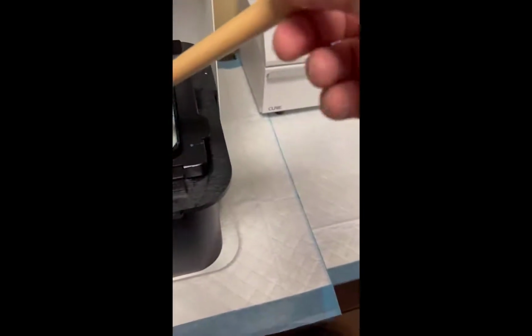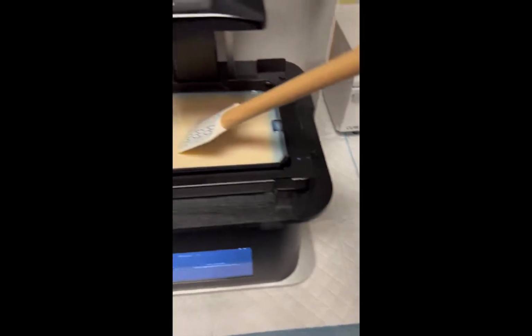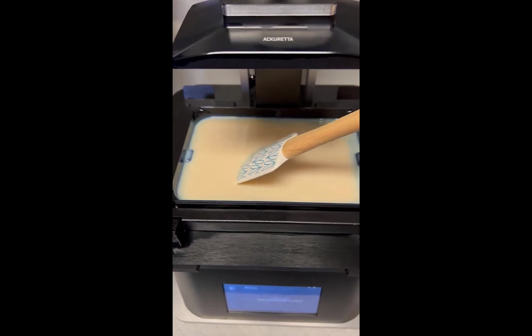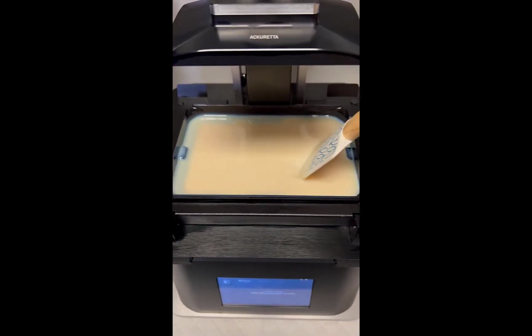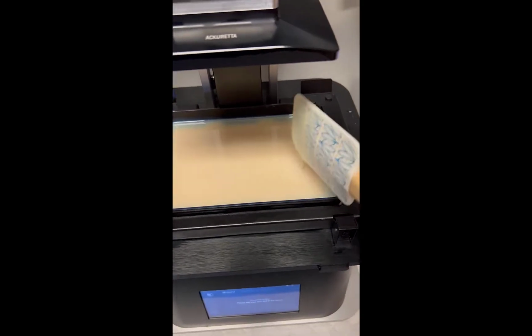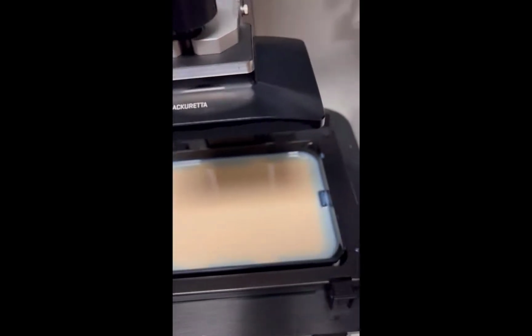And on that note, if you see these papers here, these are pee pads that you can get at any pet store, and they work great. They keep the resin on the top part. It never soaks through. It works just fine. So, and then I don't mind laying an instrument down when I have to as well on that, and I know it's going to be okay.